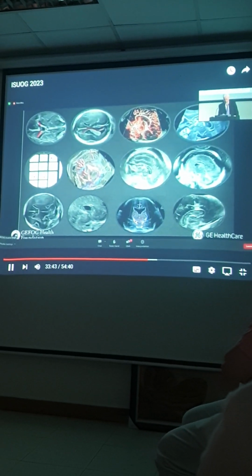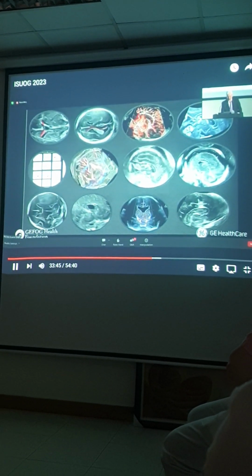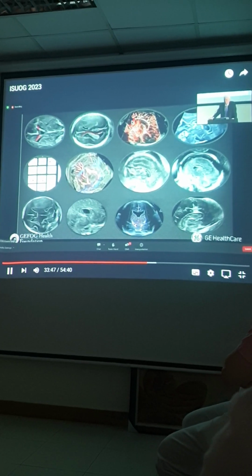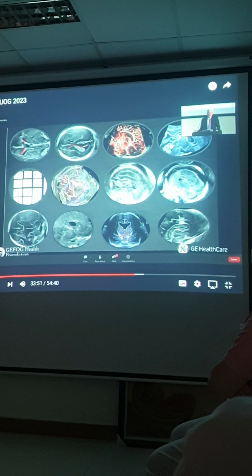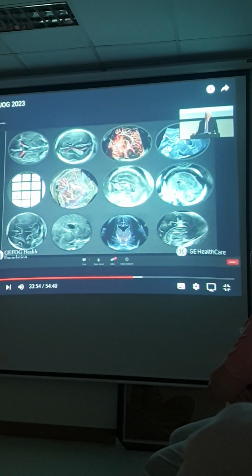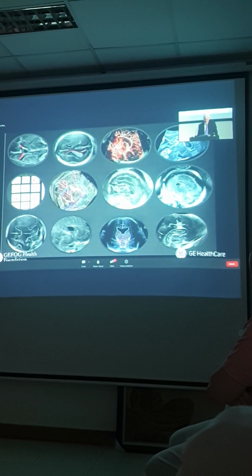Thirdly, if you are ever suspicious that there is a shortening in the corpus callosum, look for the great cerebral vein because it will define the posterior border and distinguish between a posterior partial agenesis versus a hypoplastic corpus callosum.